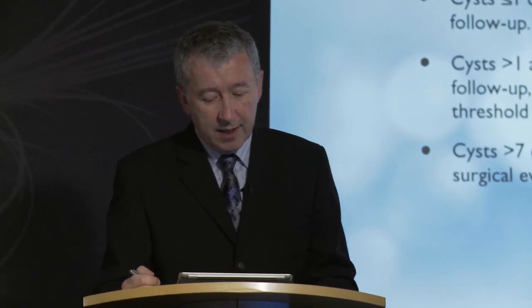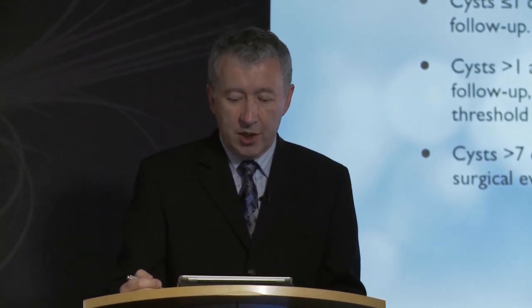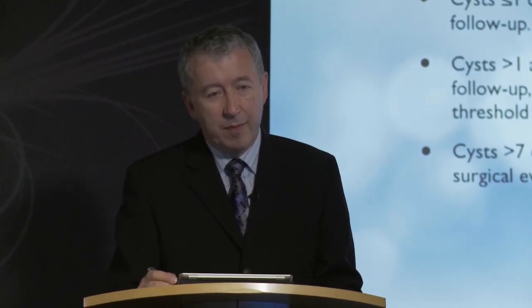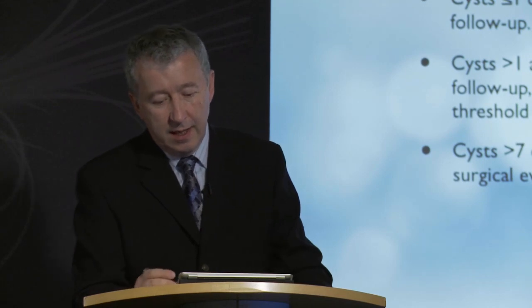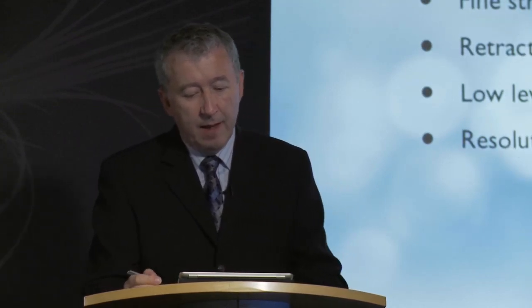And cysts greater than 7 centimeters, again, are so large that they probably should be further imaged with MRI in an effort to better characterize them, or indeed surgical evaluation could be considered.